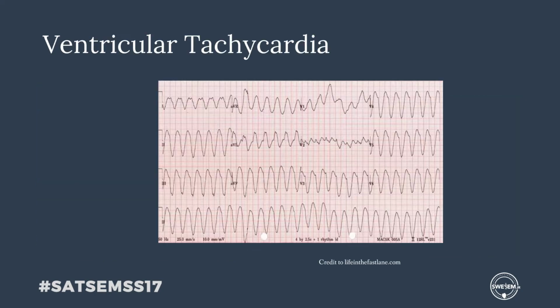So moving on to the last topic, I would like to talk about ventricular tachycardia and ventricular fibrillation, so VT and VF. Now, ventricular tachycardia is, as the name suggests, a fast rhythm from the ventricle. This is a potentially life-threatening arrhythmia, and depending on the focus of the VT, it will have different hemodynamic consequences. Now, a focus that is near the septum gives you the same direction of depolarization and contraction pattern as a normal impulse. That means that the hemodynamic effect is smaller.